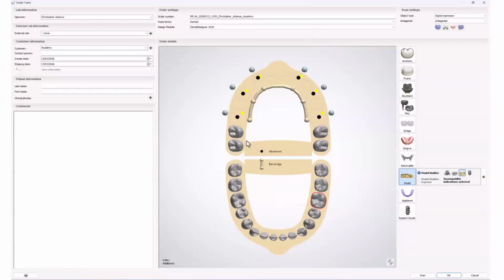Designing the secondary structure is going to be made through either RPD or dental module, and those modules prefer to have a base to the scan. So the model should be watertight. So we need to give it a little bit of a base. For implant bar option, that's not necessary.